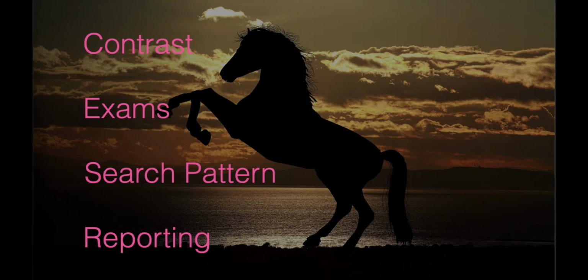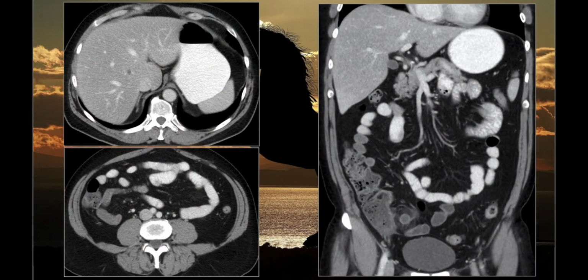Now we'll take some time to focus on the key elements of abdominal CT, including contrast type and exams based on the indication for the study. Speaking of workhorse, the vast majority of the time you'll want to stick with CT of the abdomen and pelvis with oral and IV contrast in the portal venous phase only. This single study provides the best balance of solid organ, bowel, and vascular enhancement for you to be able to answer most clinical questions. The oral contrast is bright within the bowel lumen and can aid in confidently identifying a variety of pathologies, although it is usually not necessary to make a diagnosis.